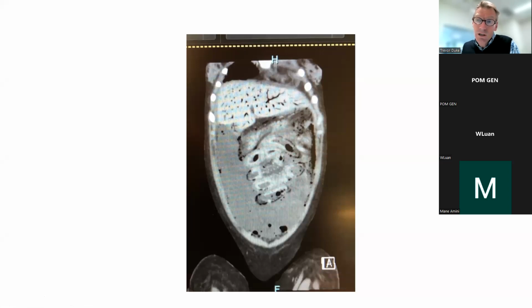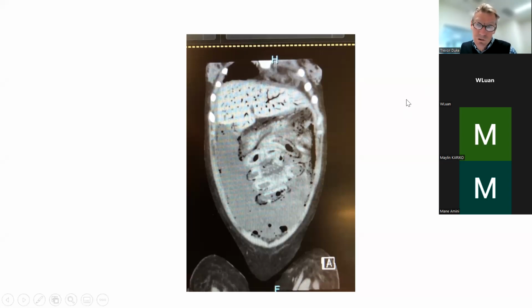Pneumoperitoneum or something. Yes, a pneumoperitoneum would usually have air within the peritoneal cavity, and there is some air in the peritoneal cavity down here. That's right. What's the name for the air in the wall of the bowel? Intramural. Yeah, very good. Intramural gas, or sometimes called pneumatosis. Pneumatosis coli is the full name for it. So this is severe pneumatosis where you can see almost all the bowel wall has air in it. And there is also pneumoperitoneum. And there's more than that.